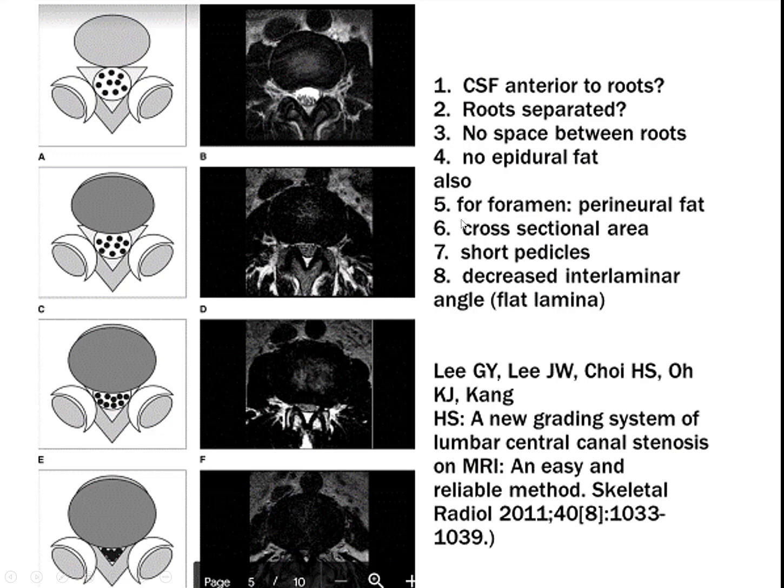There's no space between the roots. Epidural fat: you see here is a nice epidural fat, no epidural fat. That's how stenotic it is. Perineural fat in the foramen.